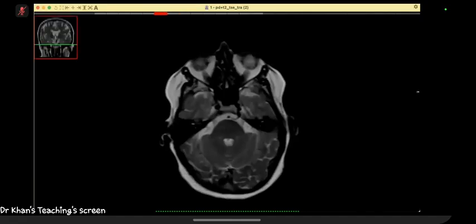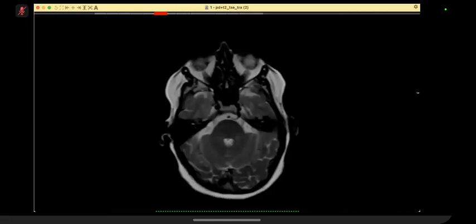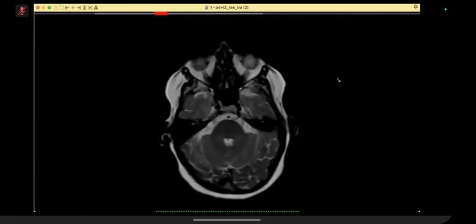This artery looks a little bit tortuous and dilated. I can see what appears to me like a small saccular aneurysm arising at this artery that I like to confirm in the other sequences. Which sequences would you like to see? I like to see MRA images, if available, and the coronal sequences.